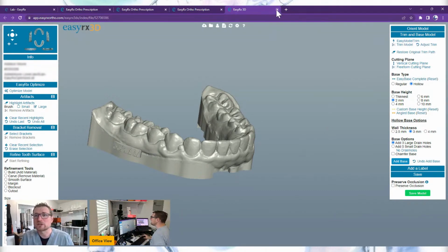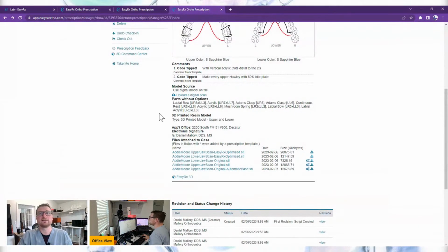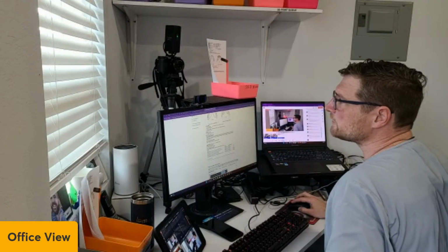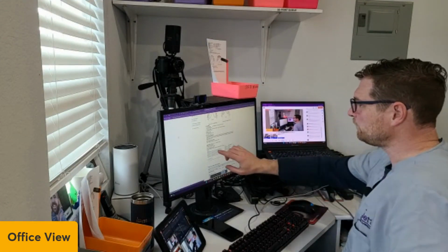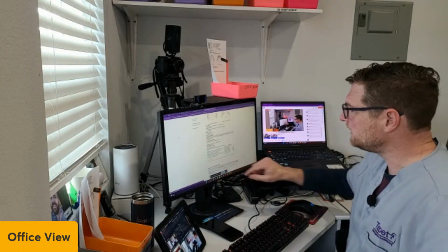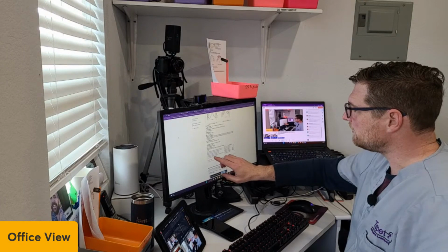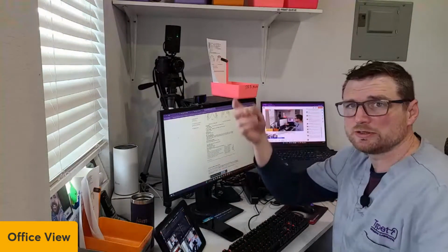And then you can actually click this and it'll just shut down that tab and it will save it in here. So let's refresh this. I need to change my camera view. All right, so let's refresh this. And if you look down here, it's going to add the name, the invoice number, and then hollow. But you can name whatever you want. I usually just use the default naming.